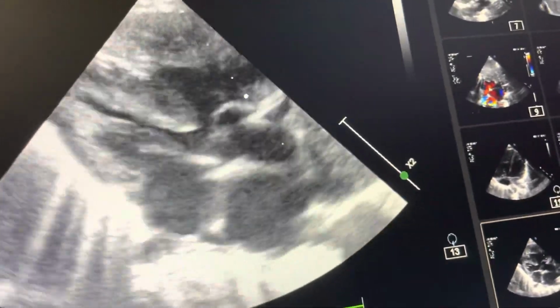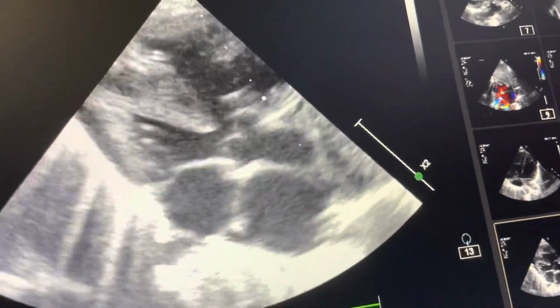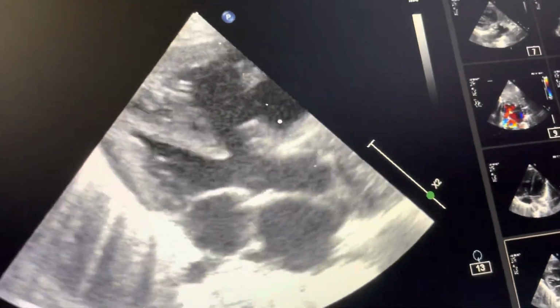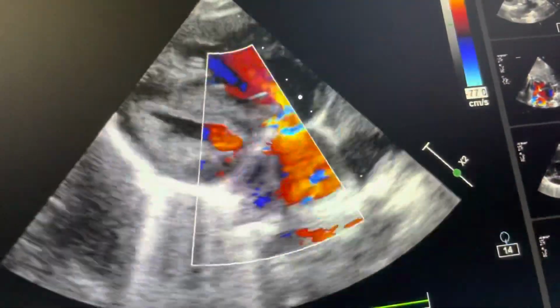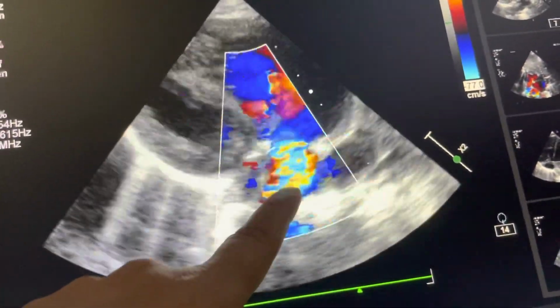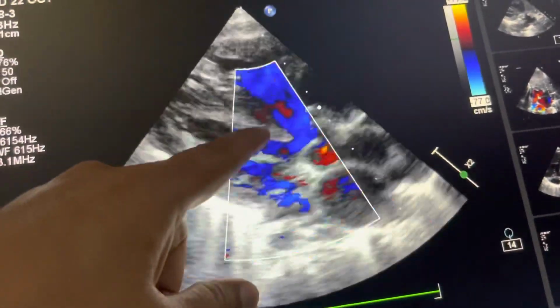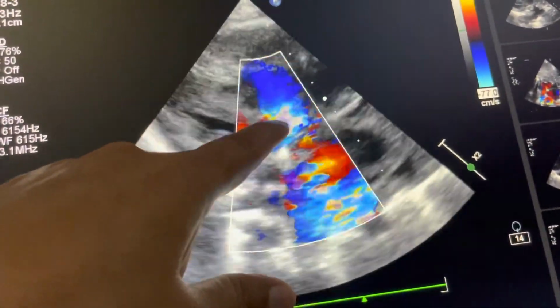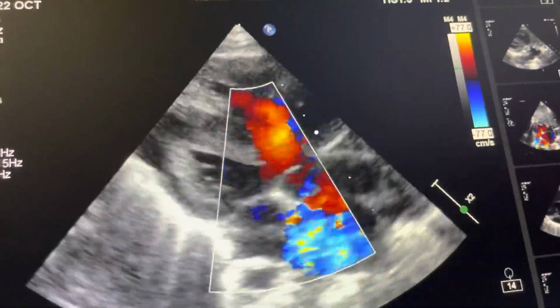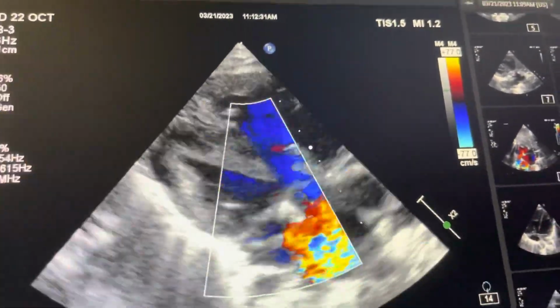You see the post stenotic dilatation is present if the stenosis is at the level of the valve. That is the finding in this case. You see the next image. This is the right pulmonary artery, left atrium, left ventricle, and in some views, what you see, this is the pulmonary valve and significant pulmonary stenosis, and pulmonary regurgitation is also seen in this image.